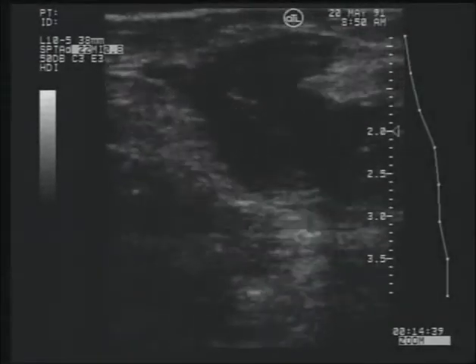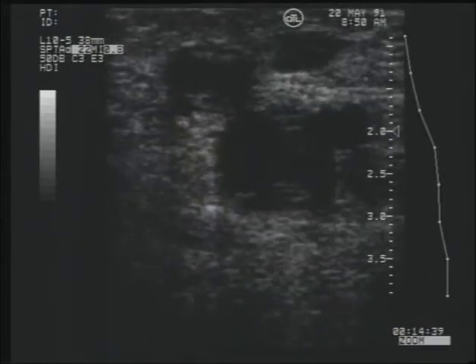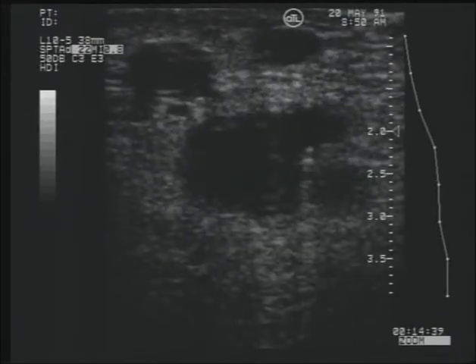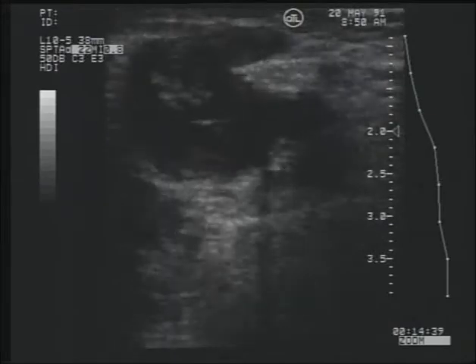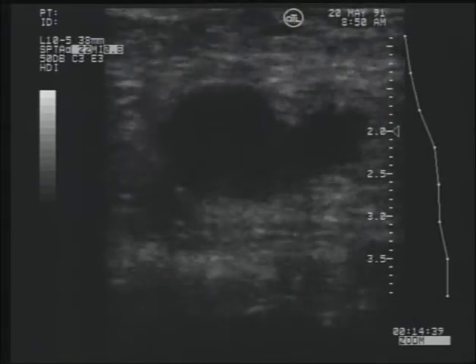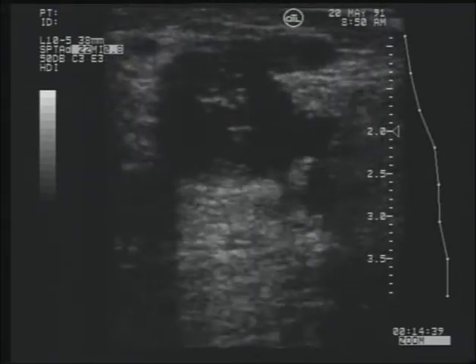As it ages, thrombus becomes more brightly echogenic. This makes thrombus easier to see for a while, but as the aging process continues, the thrombus becomes so brightly echogenic that it begins to blend in with the surrounding tissue. This is one of the reasons why patients with very old disease have vessels that seem to disappear over time.